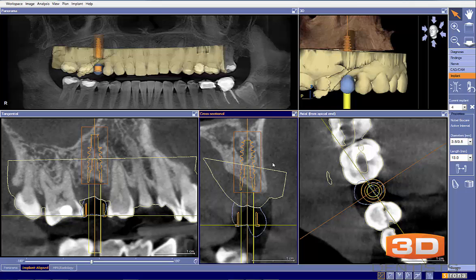So now they can do up to a 20-degree angulated screw channel in the posterior to allow you to get screw access through the occlusal even on slightly off-angle placed implants. So getting a screw retained restoration in this particular case should not be that hard for any adept surgeon placing this on your behalf. So hopefully this makes sense, and I greatly appreciate sending this case in.